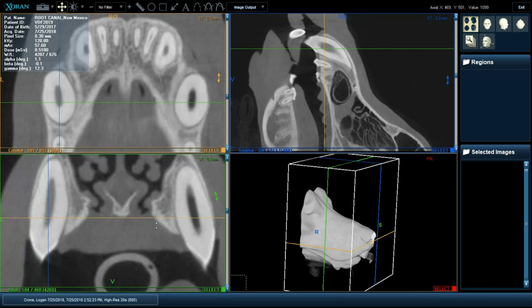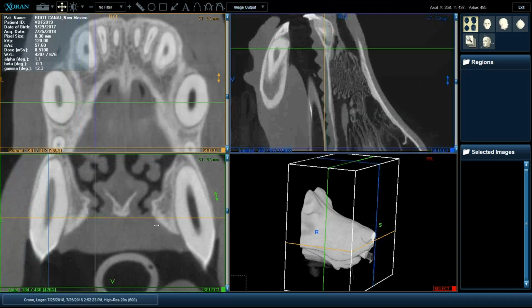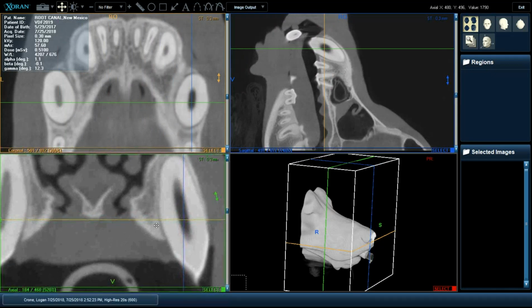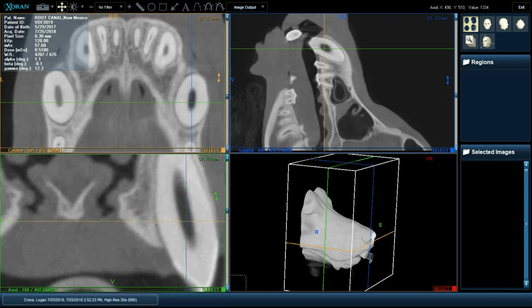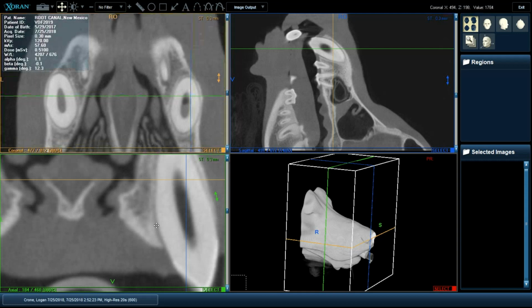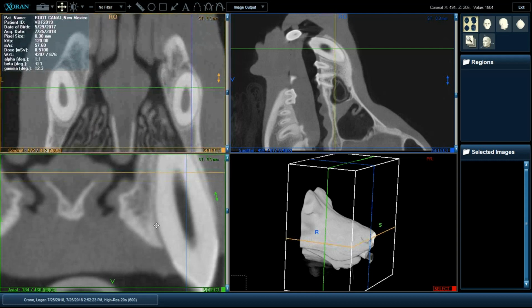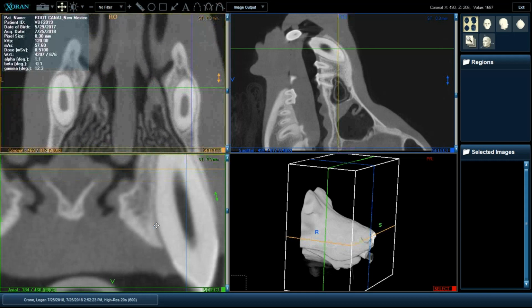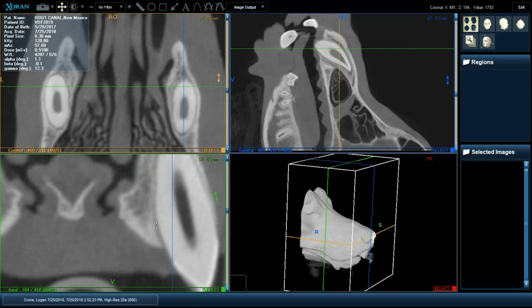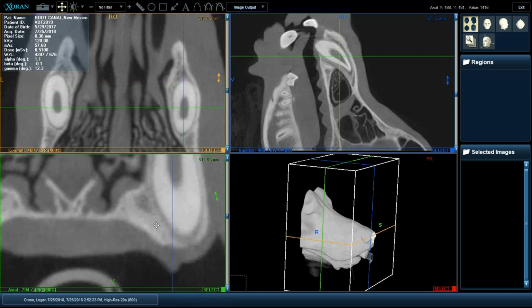And you can see it very well here. In fact, if you look more carefully in great detail, which we can do, you will notice that there are parts of the pulp that are still occupied, as you'd expect. In fact, as we make our way to the apex, we'll probably find tissue, and here it is. You can see here that there's still some soft tissue present. But obviously, this root canal is no longer vital, at least in great part, and we can now go ahead knowing that we do need to proceed with treatments.